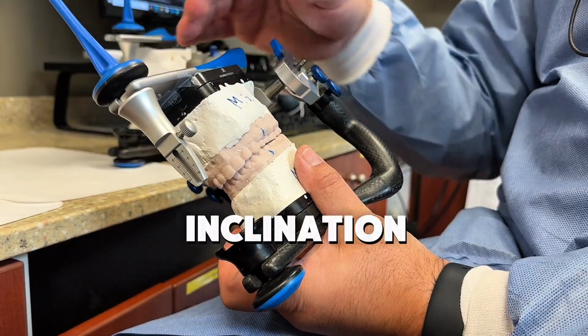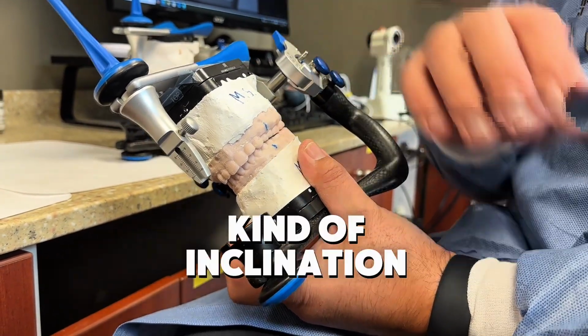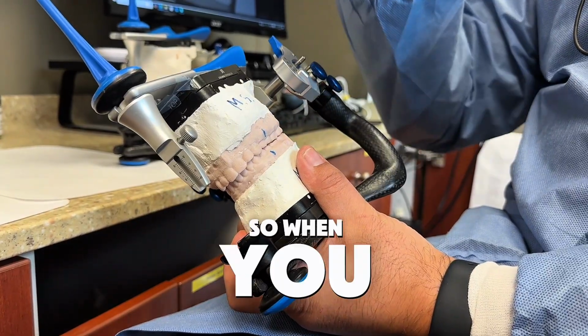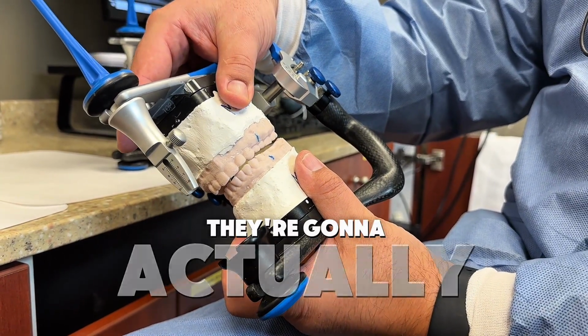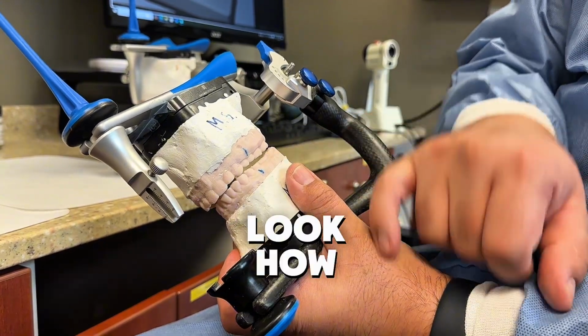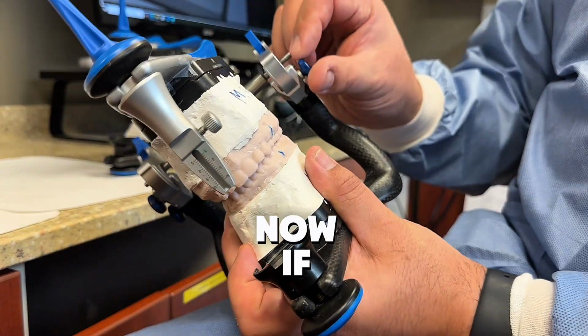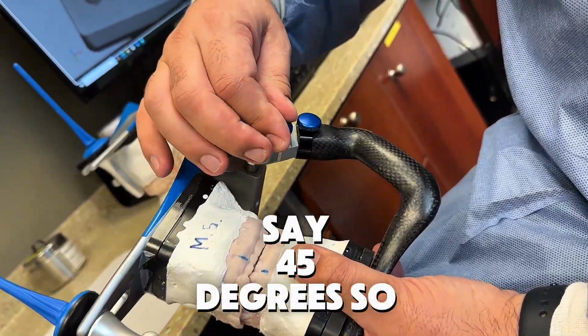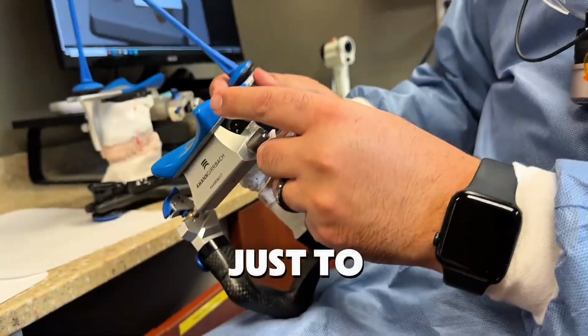Now, what happens if they have an inclination of 10 degrees and you set the condylar inclination to 25? Now you've made a mistake. You think you have more room in the back, so when you make those cusp tips, they're going to actually bump each other when you move. See right now? That's the inclination. Look how little room there is. Not a lot of room. Now, if I change it to, let's say, 45 degrees, I'm going to make it more extreme, just to show you.